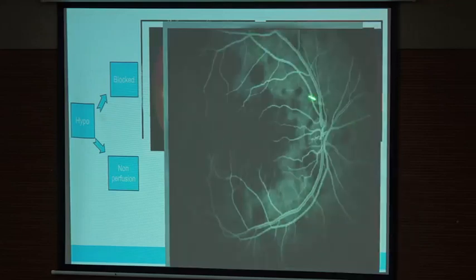And then, as I told you, it is primarily the retina, but yes, it can pick up the choroidal lesion also. So the artery is filling, but you can see these dark areas because the choroid is also not getting filled. There are some granulomas in the choroid which are not being filled here, not filled here, filled here, not here. So you are able to see this kind of non-perfusion because of the retinal vessels, and also in case of choroidal etiologies.